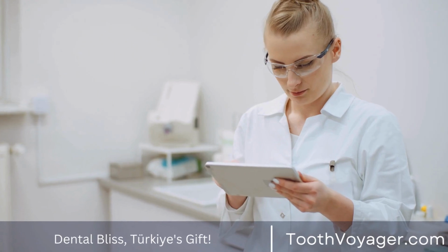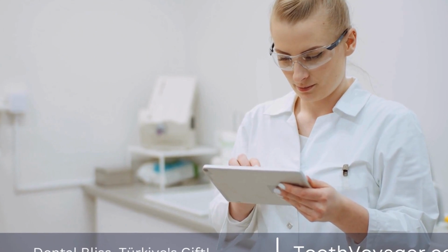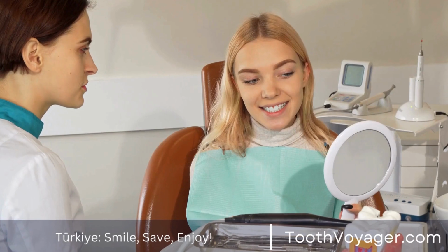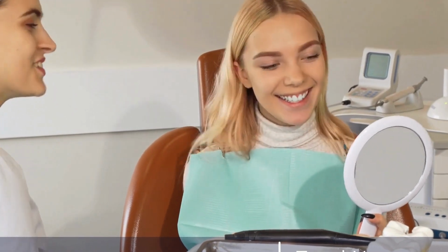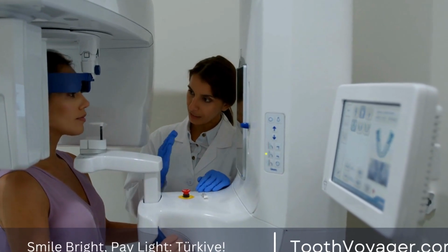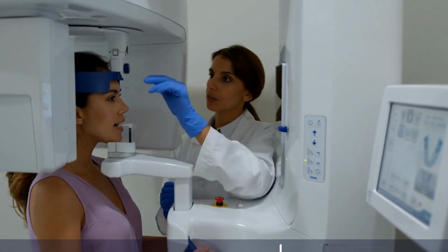During the process of making dentures, the dental technician is in close contact with the patient in order to make sure that the prosthetics meet their requirements. It is possible that the patient will need to attend numerous fittings to adjust to the prosthetics in order to provide maximum comfort. It is important for patients to give information during these appointments so that they can aid the technician in tailoring the dentures according to their preferences.